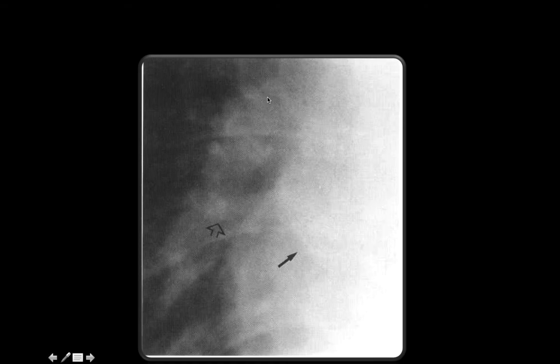You see the pulmonary vessel is going this way, and there are some that look like calcifications, but they may be pulmonary vessels in end-on view. They are vessels. Why am I calling them vessels? Because vessels contain blood, and the blood will definitely be white. They will not be black.